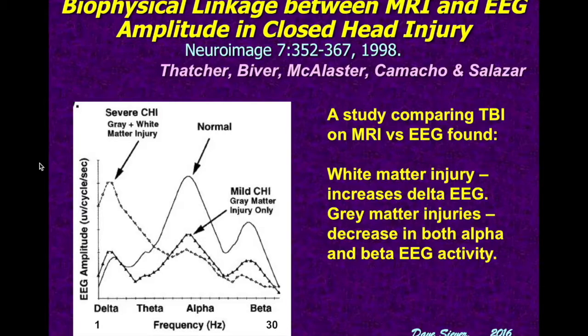In this example of brainwave activity, an EEG, electroencephalograph, in this case, we see normal activity. Notice the peak right here. This peak is at 10 hertz in the alpha band. Then we have another peak in the mid-20s, around 22 to 28 hertz, in the beta band. This is a pretty standard healthy EEG. Notice how the theta and delta are indeed quite low.